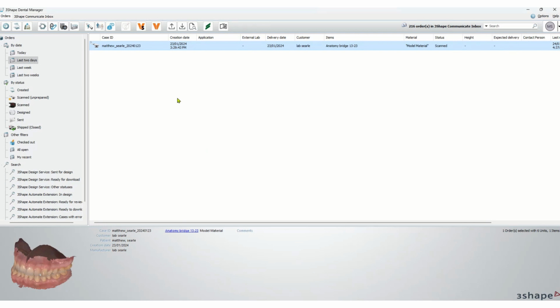Alright, just a quick workflow today to show you how to do a quick 2D real view, where you're adding the photo to the scan to do a digital mock-up, say, and then also how to add in an additional scan.